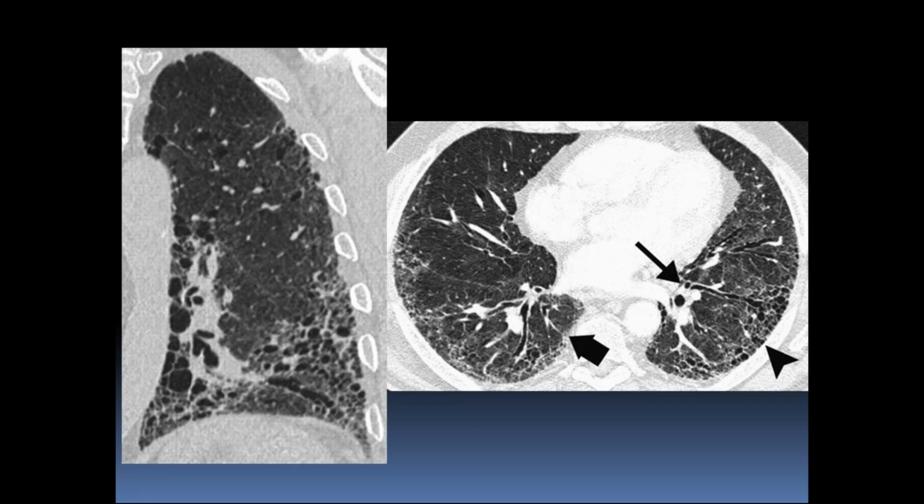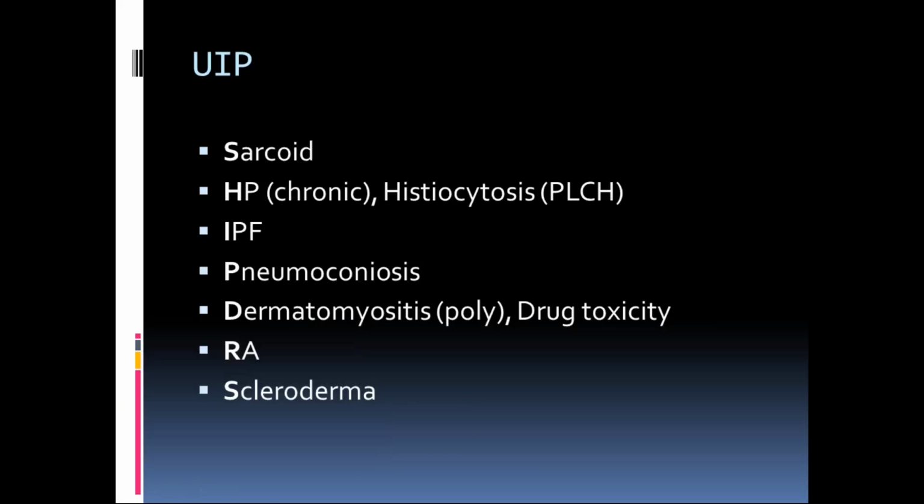So here is some of the real imaging that were companion pictures with the radiographic cartoon there. You can see that there's a fair amount of honeycombing or cystic spaces, with greater amounts along the pleural surfaces and in the basilar distribution. And the thinner arrow over here points to some of the traction bronchiectasis. You can see that the bronchi go way too far out as far as their diameter getting to the level of the pleura out there, and I'll show you more cases of that.